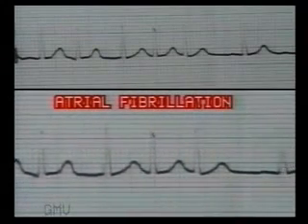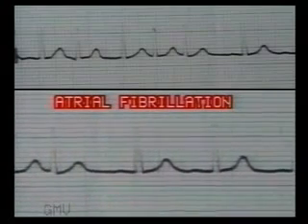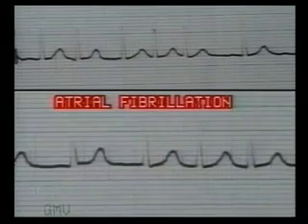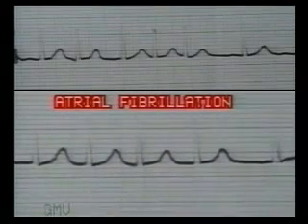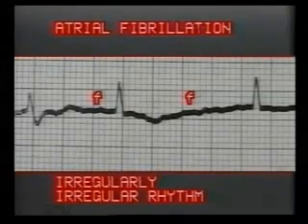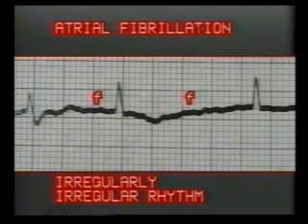This ECG shows irregular rhythm. Fibrillation waves are not seen, but a very notable feature is the absence of P waves. This is atrial fibrillation. In atrial fibrillation, the impulses follow chaotic random pathways in the atria. So there are no P waves, but the baseline shows irregular fine waves termed as fibrillation waves or F waves. Small f stands for fibrillation waves.